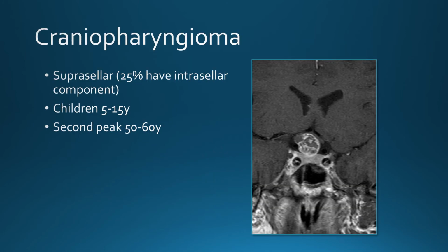So this is generally a suprasellar lesion. About a quarter of them also have an intrasellar component, most often in children, but there is a second peak in middle age, 50 to 60 years old.